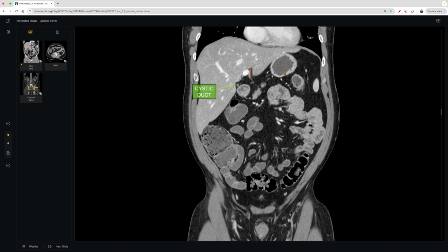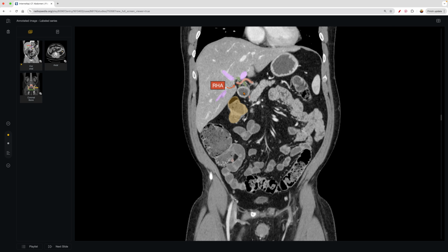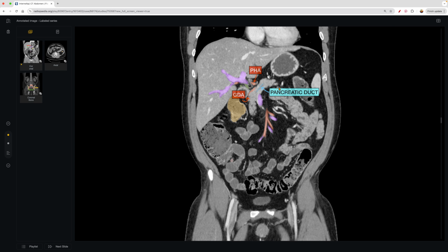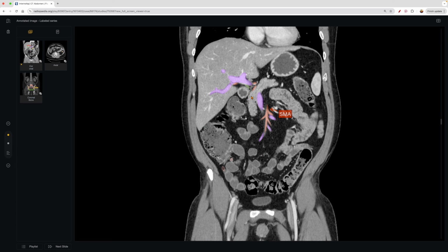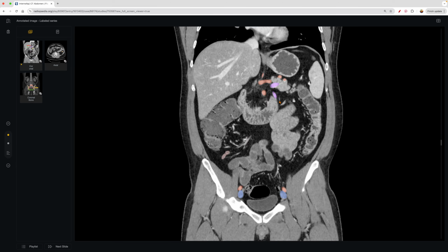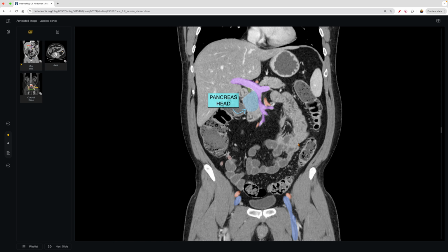Let's keep going, and then we'll see with the stomach where it transitions to the duodenum. And then the duodenum, of course, will go to the rest of the small bowel. For radiologists, they will follow and trace all the bowel. To save everyone the pain, we will not be doing that because it is a bit tedious to scroll through all the bowel and make sure everything is okay. And you'd be looking for any malignancies in terms of any neoplasms or any type of other swelling or mucosal thickening. Those are some signs that clue you in to focus your eye in a particular area.